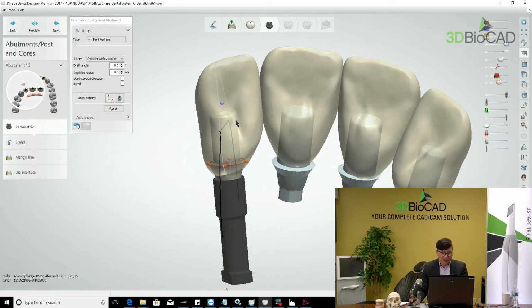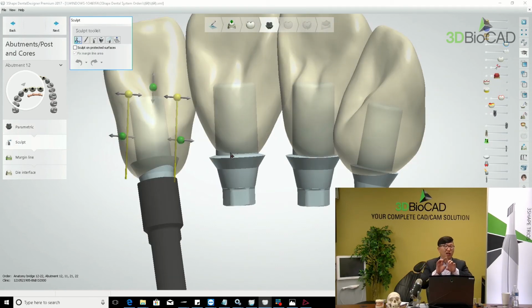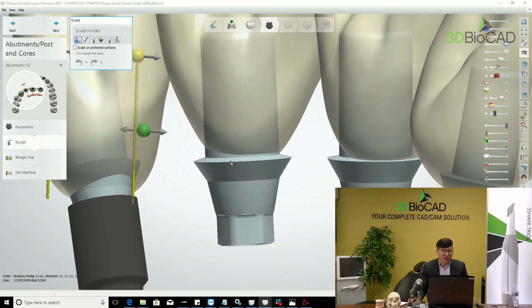Okay, and then I finish the design so it looks like a normal crown and bridge plus the custom abutment. But again, don't forget to measure it and make it the right size, but make the abutment a little bigger than your temporary cylinder, because if it's too tight a fit, the doctor has to grind out the inside a little bit to put in some cement or resin for relining. So I just make it around 1 or 1.5 millimeters bigger than the temporary cylinder.